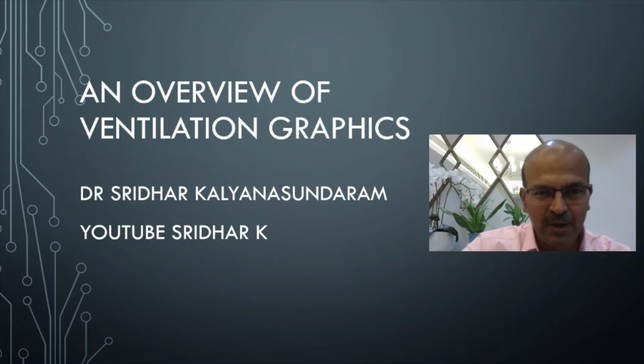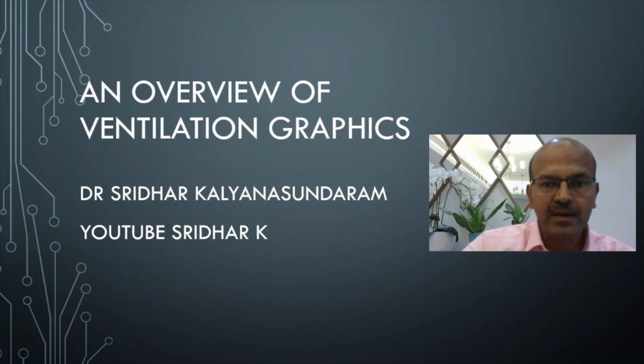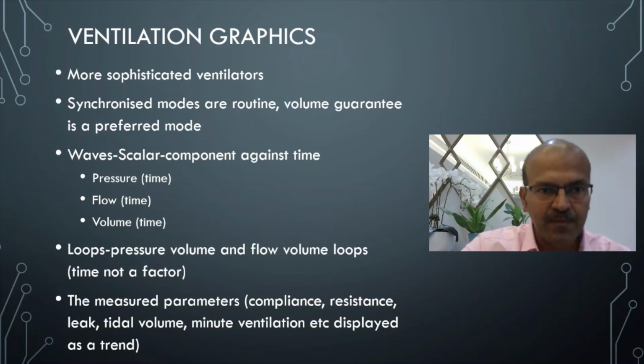Hi, many of you have been wanting a video on ventilation graphics, mainly related to how to interpret the loops and the waves that we see on the ventilator screens. I'll try to cover some of these. So we do have more sophisticated ventilators in the past 15 years or so, and no doubt synchronized modes are routine. We hardly ever use non-synchronized modes, and volume guarantee is the more preferred mode for obvious reasons.